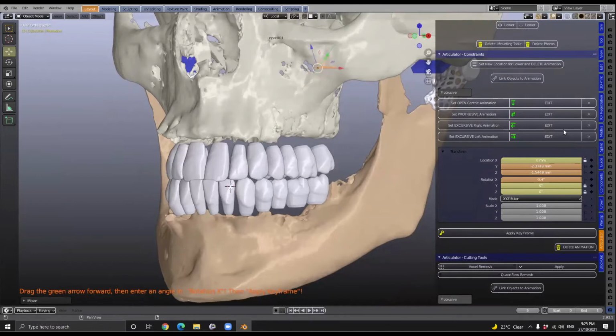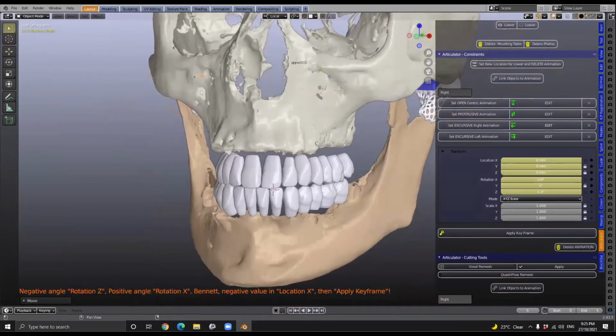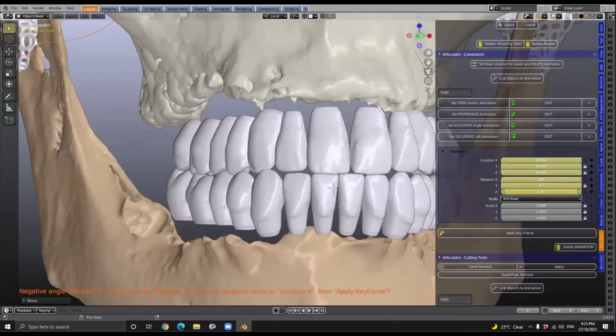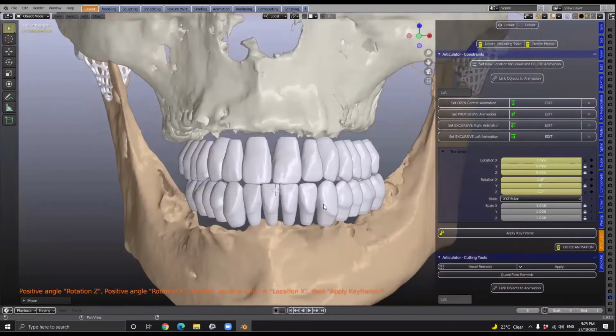And then I'm going to edit the left side. And again, I'm going to purposefully make sure that we get a little bit of trimming happening here. We close it up a little bit like that, okay? Apply. And I'm going to edit the other side as well, okay, like this.